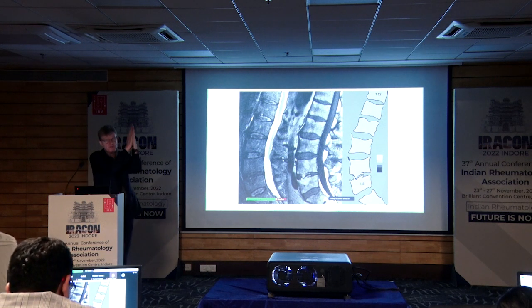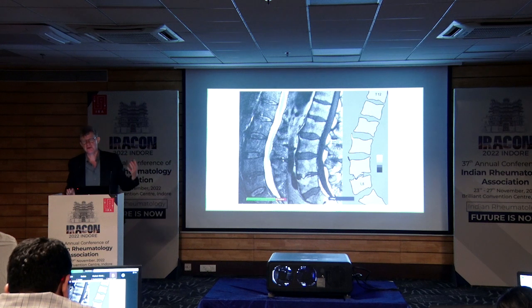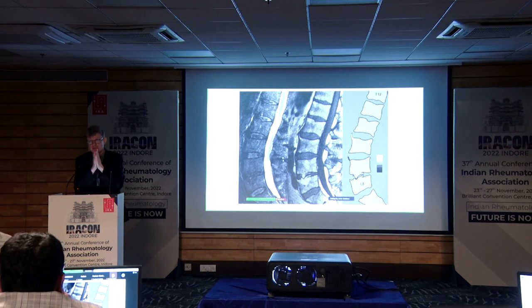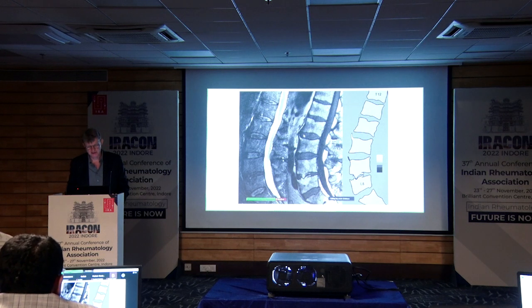When they're only cortical bone pointing in one direction, they are black. And they are black in an area of the longitudinal ligament, which is also black, and therefore you can't recognize them because you're looking for something black in something black. So you need to wait till they're larger, and therefore you can say at these locations X-rays are actually better to see syndesmophytes, and CT is the best. But it may not be so incredibly crucial for you to recognize these syndesmophytes, but it is not the strength.